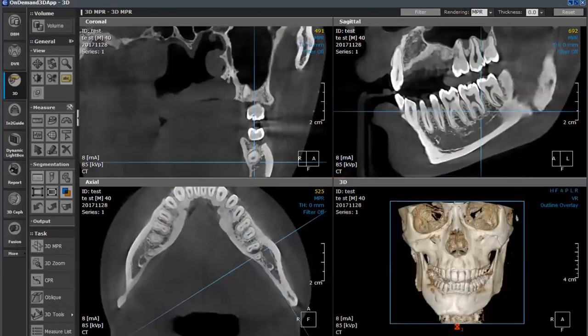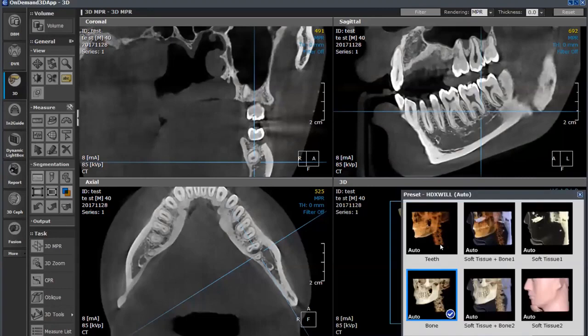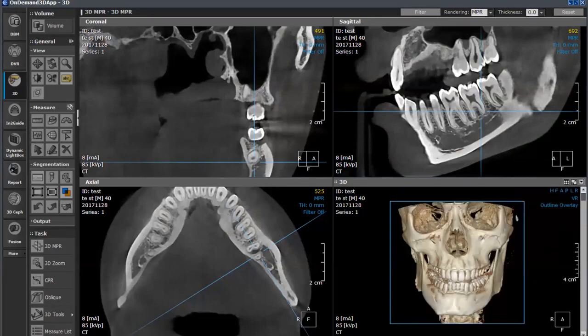We're going to measure. We're going to look at it from a buccolingual perspective. We can break it apart with 3D zooms. We can look at that tooth in a 3D form, looking inside the sinus, outside the sinus, around in the bone. We can also do it changing the bone window. If we change it to the teeth window, that will allow us to look at it more from an X-ray perspective. So we can look at the tissue, bone around there, but also see, again, maybe post-procedural, the obturations as they happen.